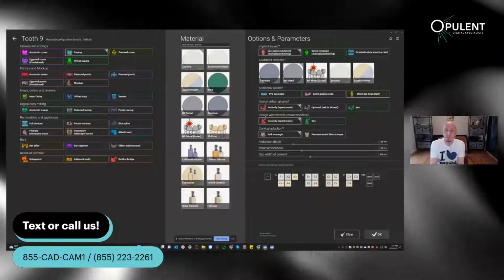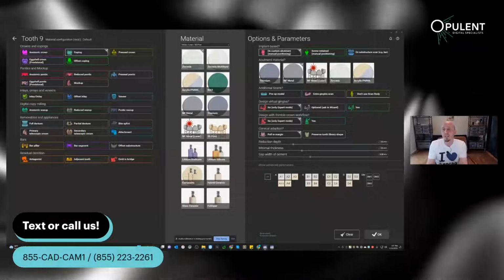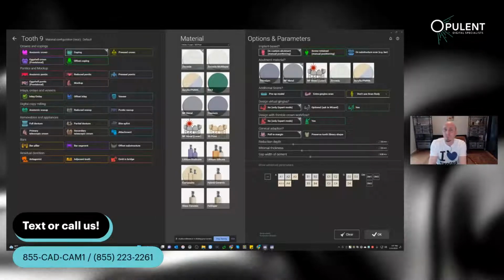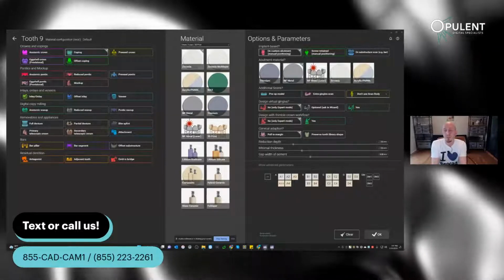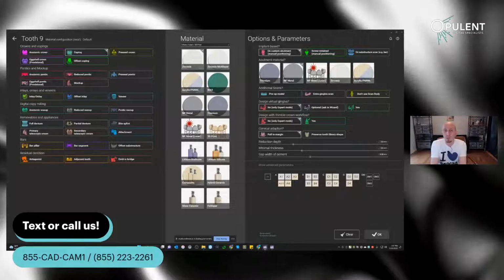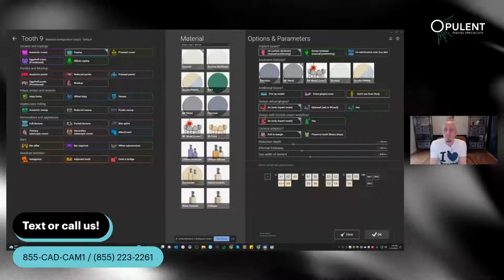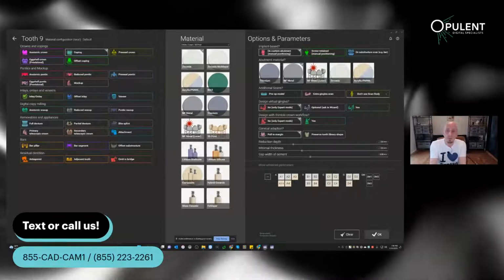The other reason could be the part is all correct and it fits well, and you are maybe realizing, oops, there's no room available. What am I going to do? You're maybe starting making phone calls with your doctor and warning them, hey, I need to modify that. The minimum thickness in the implant library may not allow you to go below that.